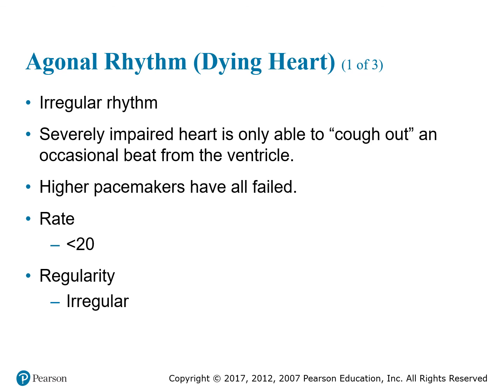So your impulses may come in at different levels. There are no P waves, so therefore you don't have to worry about a PR interval. And your QRS complexes, when you do see them, are usually wide and bizarre, and the intervals are greater than 0.12 seconds.